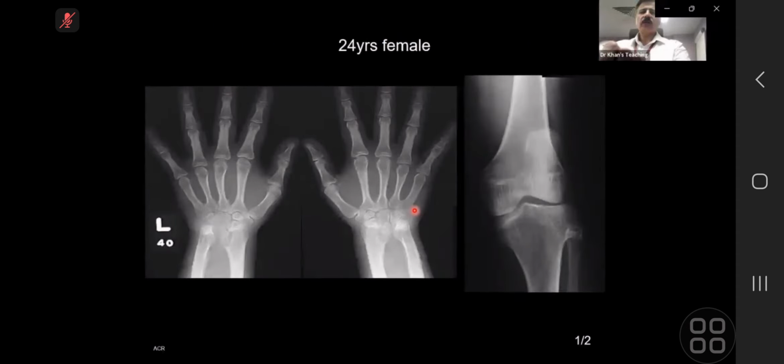Having said that, here you have got short metacarpals, usually fourth, but third and fifth can also be short in Turner syndrome. And in Turner syndrome, for the sake of making it a unifying diagnosis, at times the medial epiphysis of the tibia is also flattened like this. But this finding, don't expect it in the exam.